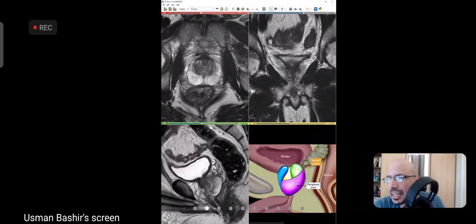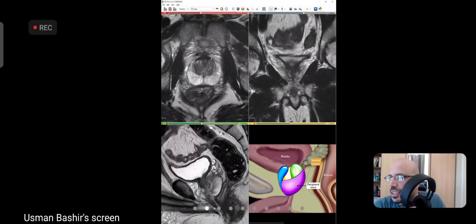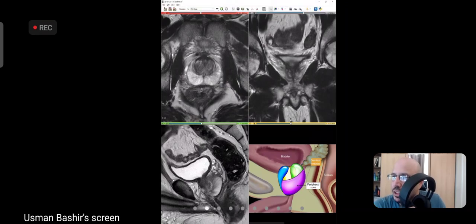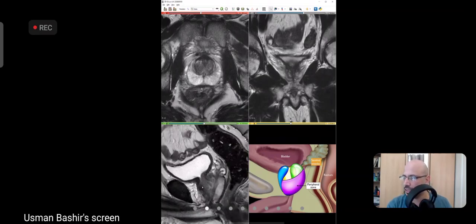Histologically, अगर आप definitions पढ़ेंगे तो funnily enough, जो मुझे definitions मिली हैं, they say that the pseudocapsule is fibromuscular tissue and anterior stroma is also fibromuscular tissue. So it's funny to say that they are separate structures, but actually you can see that on MR, this is a bit thicker, darker, and the anterior fibromuscular stroma is considered part of the gland, whereas this thin black line around the gland is called the capsule. Okay. So this is the prostate capsule on the sagittal as well, and you can see that in the midline, this bit is deficient, and it's called the stroma.